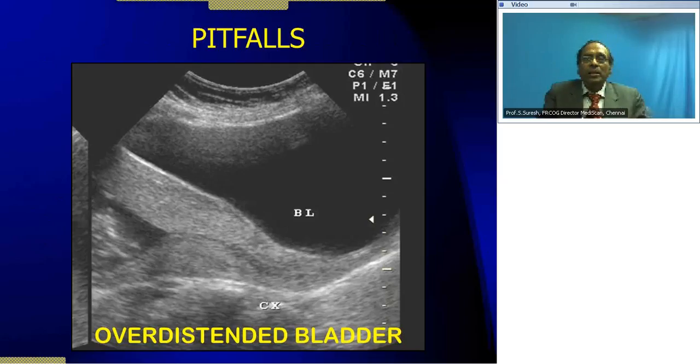And if you see a placenta which is completely covering the internal os in early pregnancy, let's say in the second trimester, then it's unlikely it will completely migrate upwards. So a fundal placenta will never become a placenta previa, and a complete previa in the second trimester is highly unlikely to migrate completely. It may migrate partially, but the threat of placenta previa being there is always high.